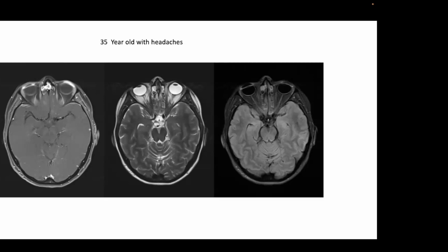To be honest, I'm not an expert, just like Anna said, of the ophthalmic imaging, but of course there is definite asymmetry, you know, the eyes are asymmetrical. The right one is much smaller than the left one. Maybe there is some kind of implant there.